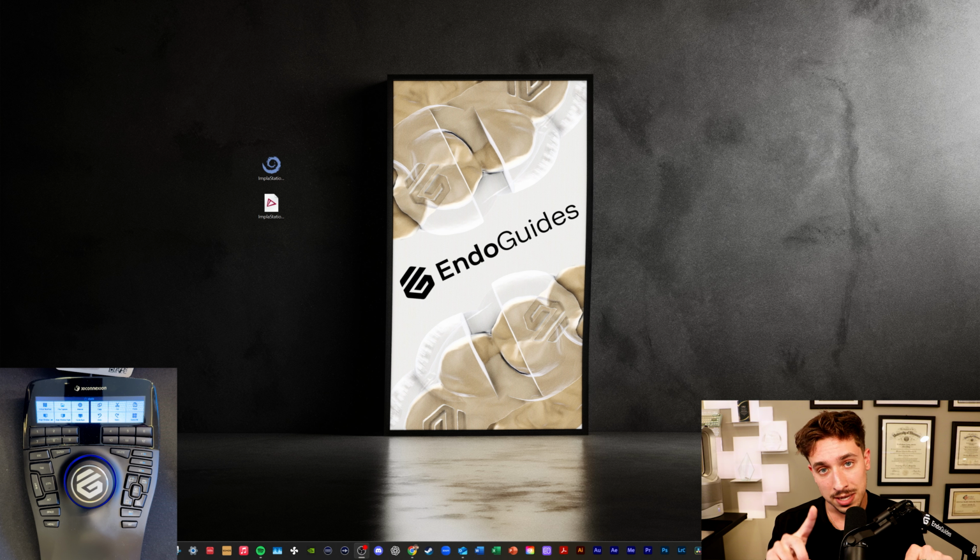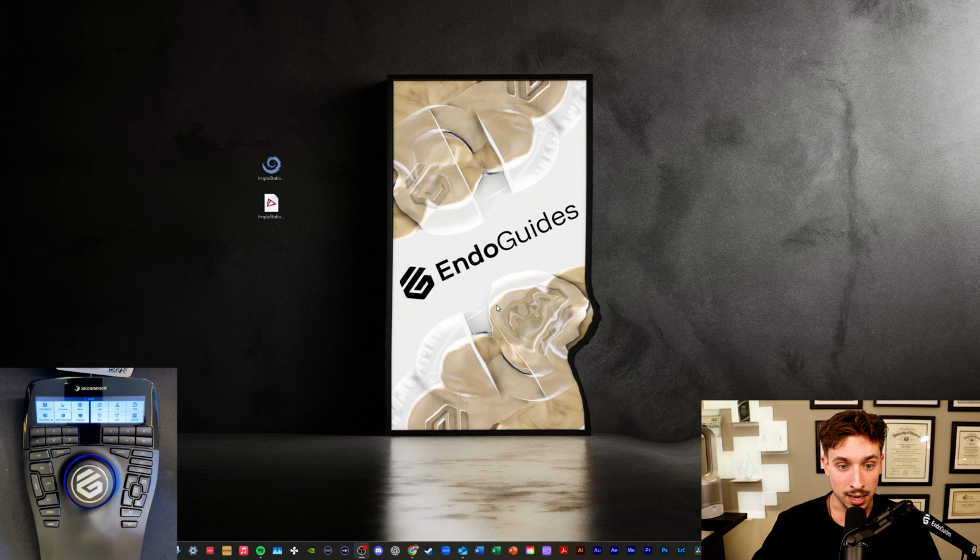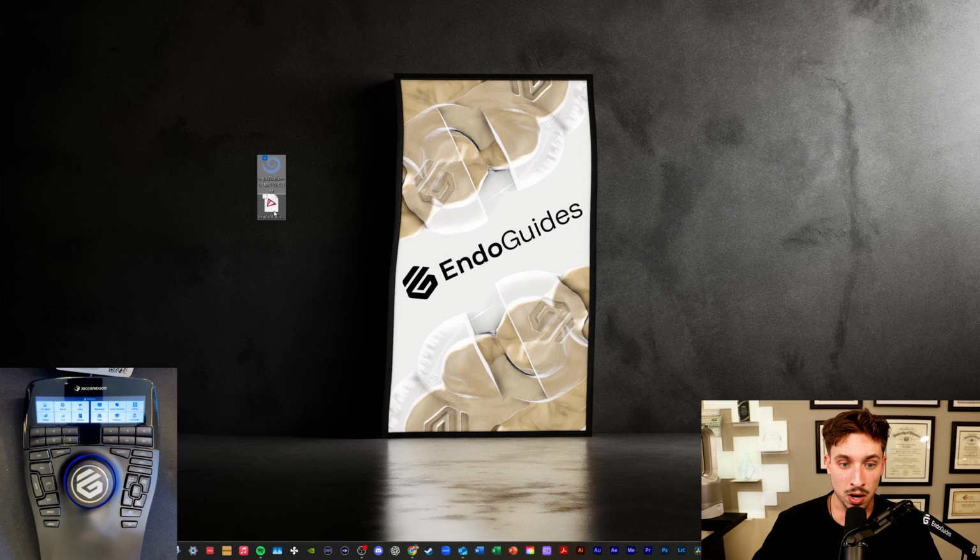You're going to need the CBCT volume of the patient, which will be exported in a DICOM format. Really important in a DICOM format. And then also you'll need an intraoral scan or a scan of a cast of a patient in an STL format. Okay, and that's what those sample files are that you can find down below. So you can see here that we have these just put on our desktop right here, both the DICOM volume and then also the STL.